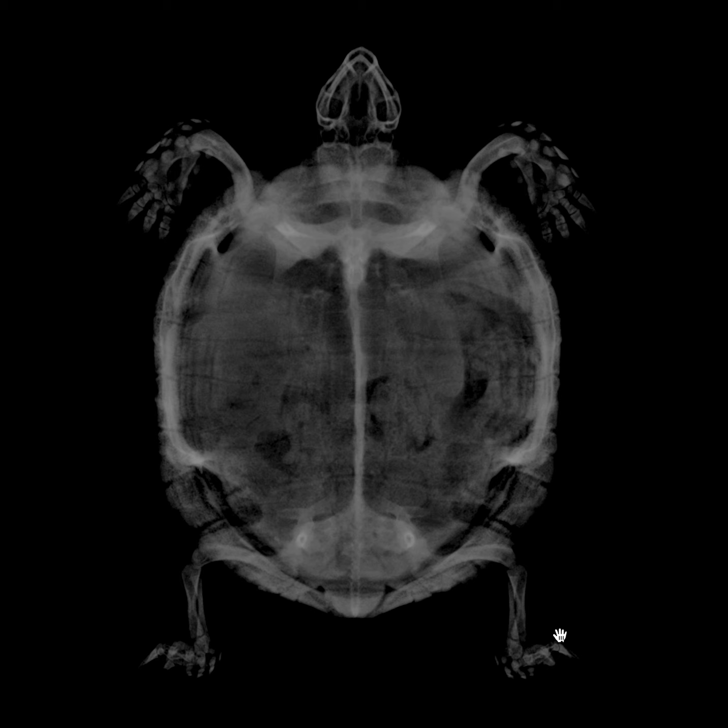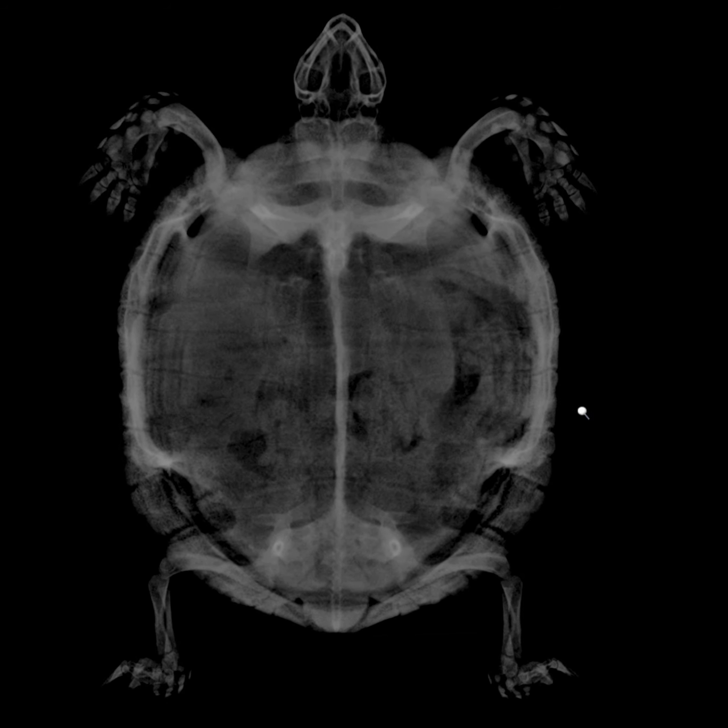Okay, we start our assessment with the dorsoventral view. On the left side of the coelomic cavity, you may have noticed that there is this well-delineated fusiform structure, and this reflects the stomach. So in the lumen of the stomach, there is quite a large amount of radiolucent material, which is gas.